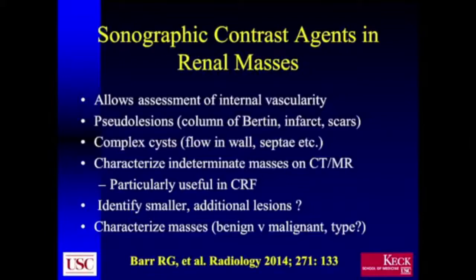Contrast ultrasound can also be useful in characterizing indeterminate masses that have been identified on CT or MR. This is particularly useful, and there are several recent publications showing how superior contrast ultrasound is in characterizing masses in patients typically who have chronic renal failure or who, for other reasons, can't have contrast. So there's very little question in my mind, at least, that contrast-enhanced ultrasound is a far better way to evaluate masses than just going with a non-contrast CT or MR.